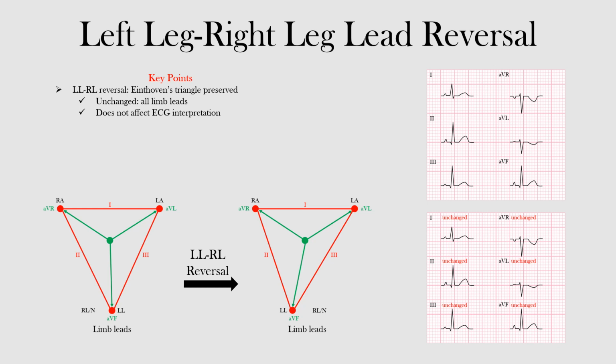Now, that won't be the case here because we'll look at when we disturb also the right leg, or that neutral electrode. Remember, the goal here is to be able to see why these EKG changes occur and then be able to reason them out on your own instead of memorizing anything. So we'll also mention a few things that can help lead us to it. And I think you'll find this one an easy one when we switch these lower limbs, okay?